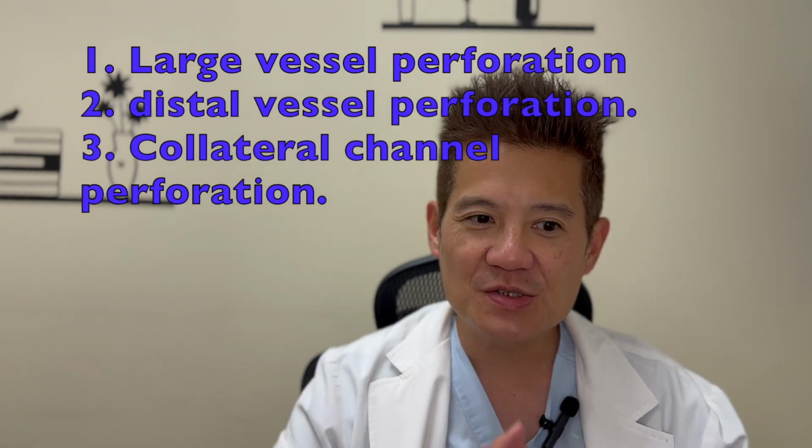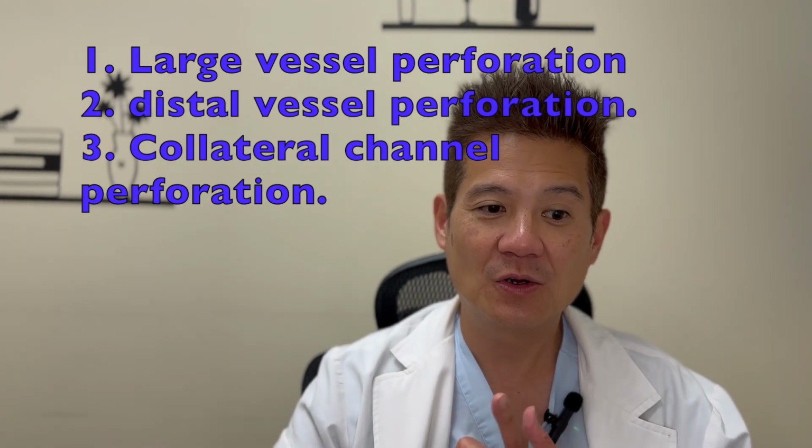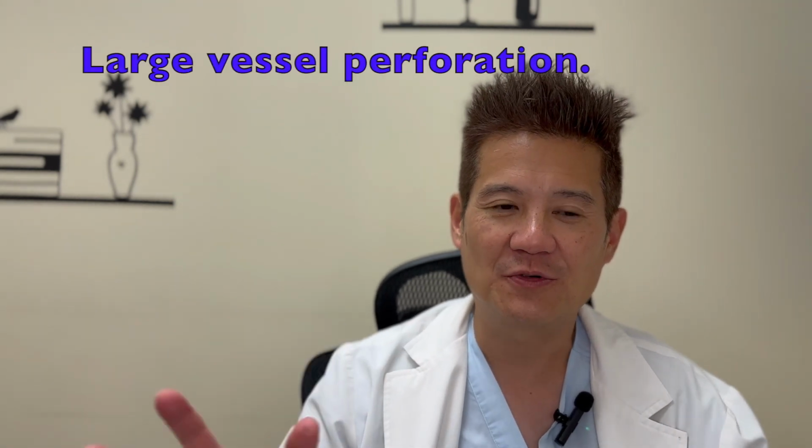So we've structured this section into large vessel perforation, distal vessel perforation, and collateral channel perforation. Now, collateral channel perforation shouldn't really happen in normal PCI unless you're very careless with your side branch wire or septal wire or something like that. So collateral channel perforation is maybe more dedicated CTO PCI perforation. Large vessel perforation and distal vessel perforation can happen in normal PCI. So first, let's talk about large vessel perforation.